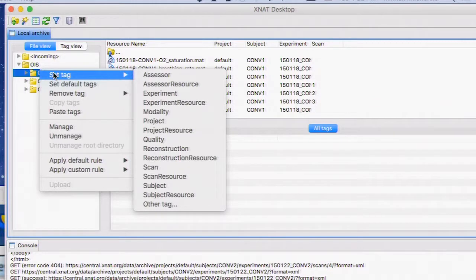So there are many tools to assign individual project, experiment labels, and up to resource label. So that would help if the data is not completely 100% homogeneous and you can't completely program around it. Well, the other way, of course, would be to just modify the data, but sometimes it's not a good option. But again, to answer your question, there's no completely scripted command line interface. This is purposed to be a desktop tool right now.